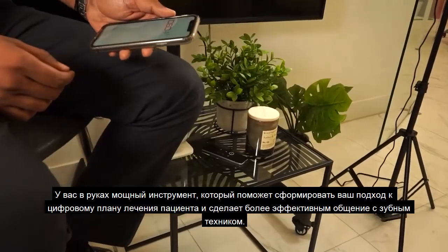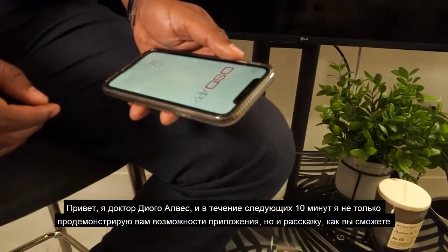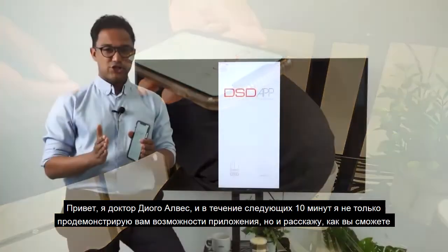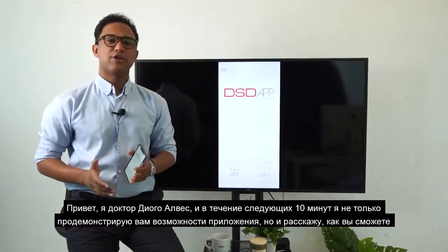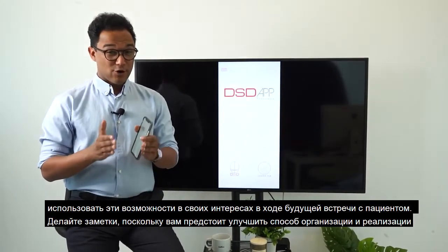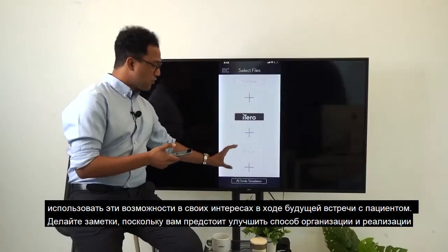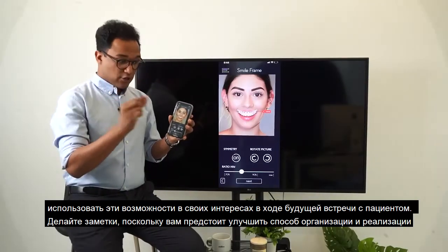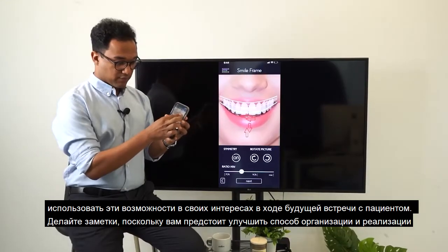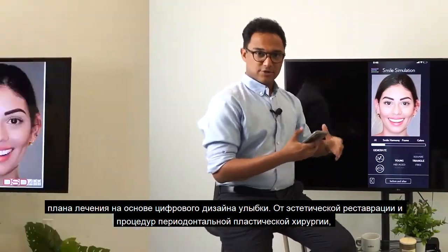What you have in your hands is a powerful tool, one that is going to shape the way you approach the digital treatment plan of your patient and improve the way you communicate with your dental technician. Hi, I'm Dr. Diogo Alves, and in the next 10 minutes, I am not only going to show you the app's capabilities, but how you can use them to your advantage the next time you see your patient.